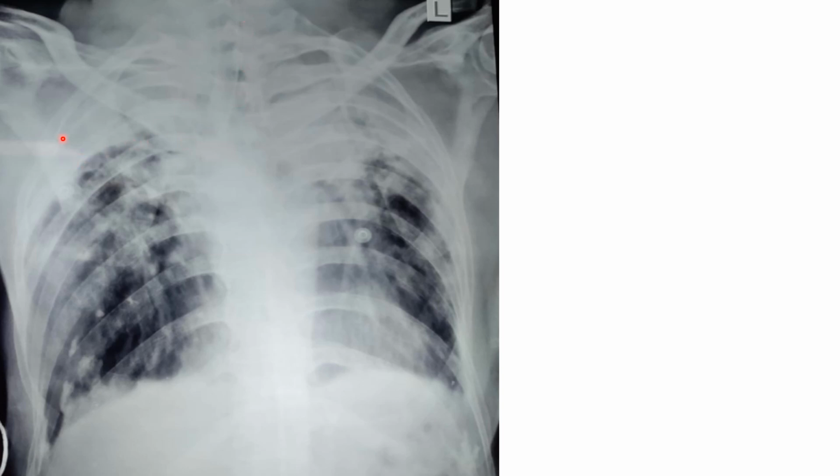Again, you have bilateral fibrosis, bilateral apical fibrosis, and here you see all these fibrotic bands. It looks really bad, this X-ray, and the patient seems to be on ventilator support. In this area, you can identify an endotracheal tube. So he's on ventilator support, and this is dense fibrosis, and then there are fibrotic bands. The whole lung is looking very bad.